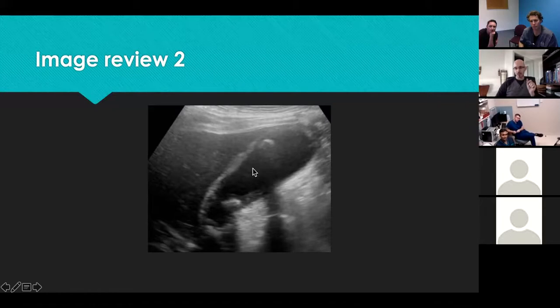Technically, with the point-of-care ultrasound machines that we have, if you imagine a curved probe, your beam widths, even at focus, are several millimeters. So it can easily have several millimeters of lateral smearing, which means it can actually increase the gallbladder wall measurement by a good 2 or 3 millimeters, which can put it into that abnormal range. So we measure where we can rely on the axial resolution of the ultrasound rather than its lateral resolution. Does that make sense?